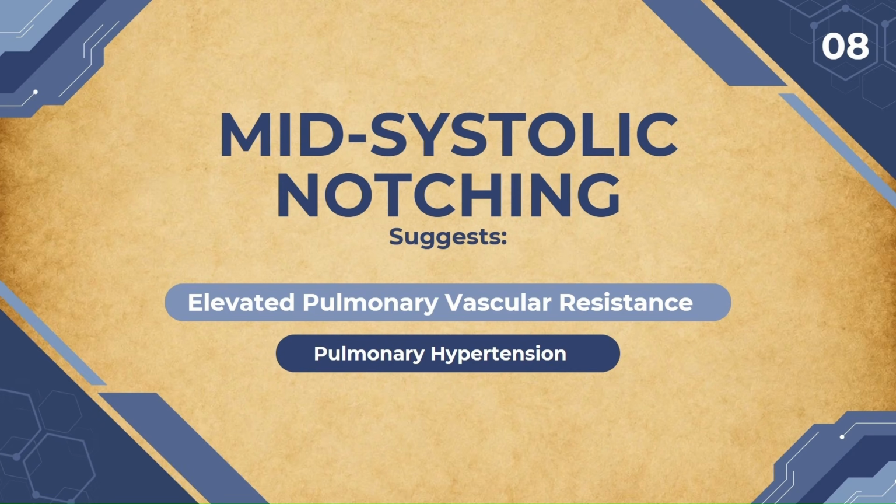Mid-systolic notching. As pulmonary vascular resistance increases, reflected pressure waves interrupt forward flow. This creates a notch within the Doppler envelope. When you see shortened PAAT, triangular waveform, and mid-systolic notching, pulmonary hypertension should immediately come to mind.